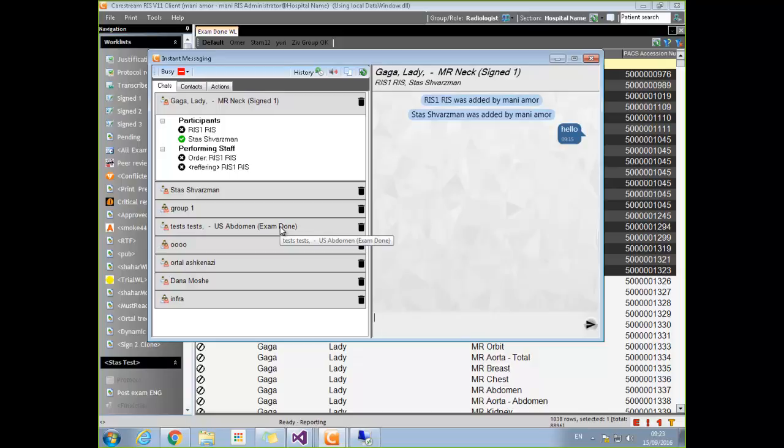Do you have any questions? Is there a way to have a pop-up? Because the icon... Yeah, we'll add it. We're planning to add something like in Outlook, when a message arrives you have a balloon window in the bottom of the screen. We'll add it later. As I said, it's in development now, and maybe it looks easy to develop chat, but it's not at all.